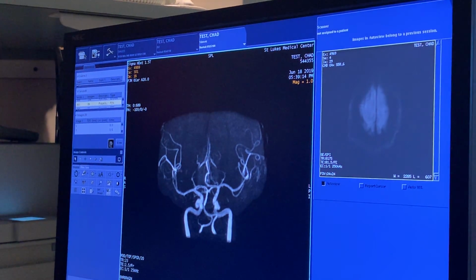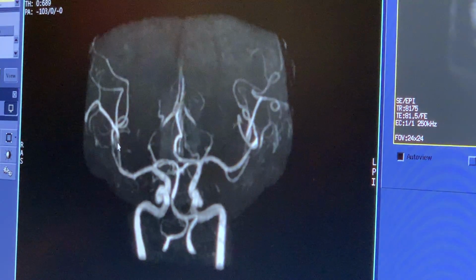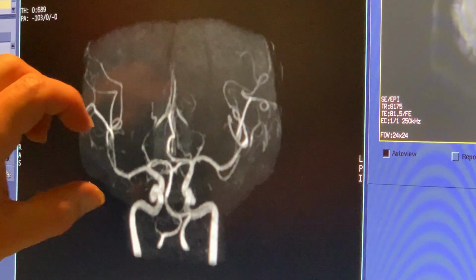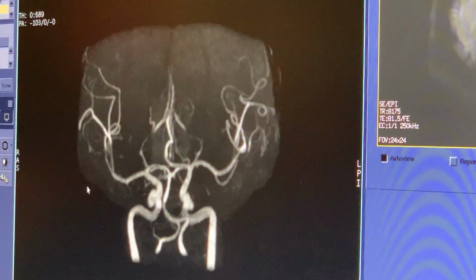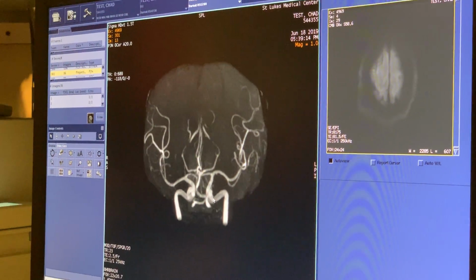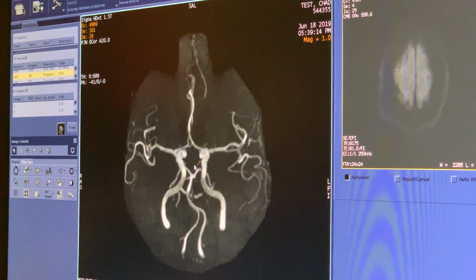We do have an interesting thing here where there's a gradient, there's more signal here than there, and so the third slab seems to have more signal than the second. That's common, that happens quite a bit. It's called signal dropout, and you'll see that. You'll especially see it right here.